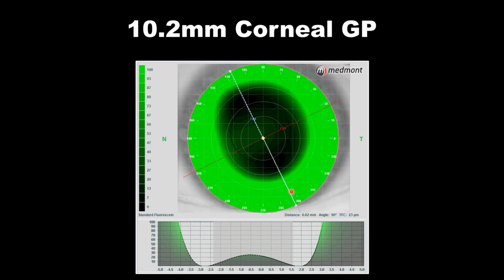And here is a specialty rigid lens designed for the irregular cornea. And you can appreciate the challenge of fitting this patient. With such a tabletop of an eye shape, you see these elevated points where the contact lens wants to bear very far into the center, and you get this grossly wide edge lift all the way around. So this patient has no hope of being fit with a regular geometry GP lens, a lens that's steepest in the center, flattest toward the periphery. We need the complete reverse.